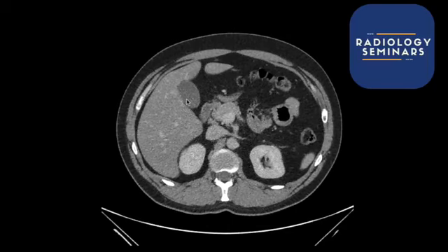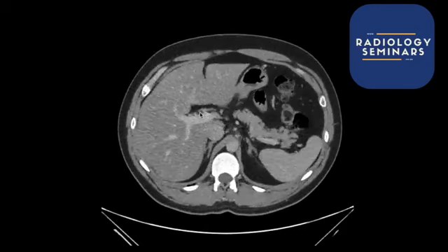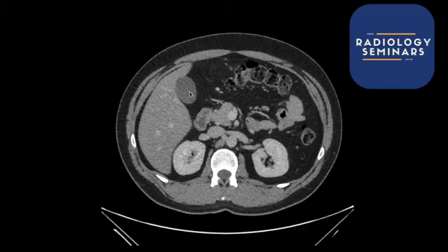Important note is that often gallstones aren't radiopaque. What I mean by radiopaque is that a CT scan is actually a glorified X-ray. And so when you've got a glorified X-ray, not everything is dense enough to stop the X-rays from going through. Sometimes stones aren't very dense, and so they don't obstruct the radiation going through the patient, and you might not see stones at all. So when you're reporting, you can say something like, there are no radiopaque calculi in the gallbladder, but there may be calculi, there may be stones, but you can't see them on CT.